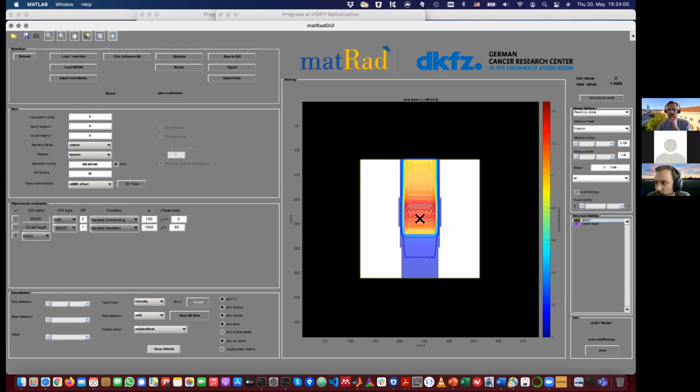This would also be true for photon or proton doses in the end, because then you could also optimize how to distribute photons given the alpha beta values, how to fractionate and so on. But yeah, the uncertainty is large, you need to be conservative, and you don't want to make wrong assumptions and overfit to a problem that is not even real.